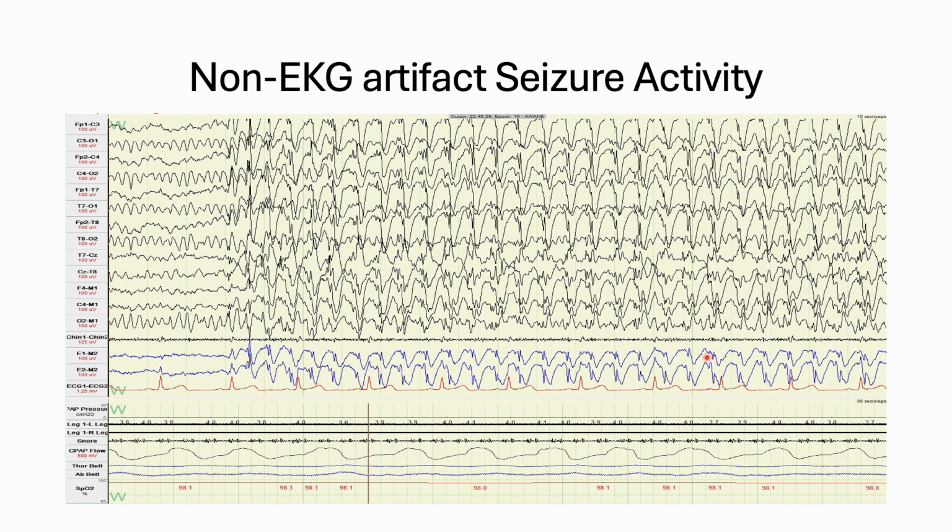The spikes are happening in the eyes as well as up here. See these spike and almost curvy waves. And a spike and a curvy wave, and a spike and a curvy wave. So they're all happening at the same time. If I take a pencil and I go up from each heartbeat, especially the QRS, that's where that's happening the most. We see that right there in the chin, we do have some EKG artifact.